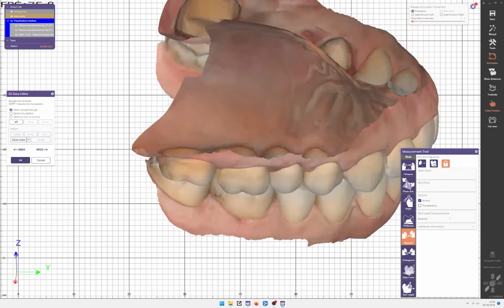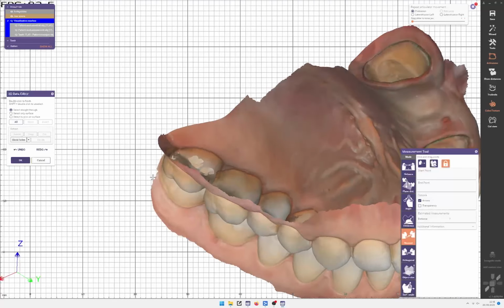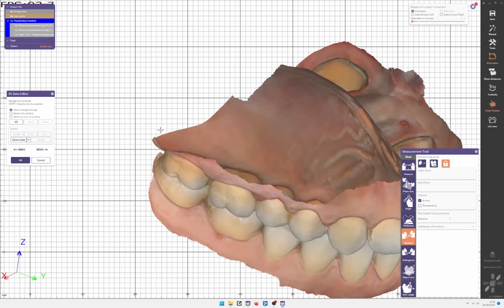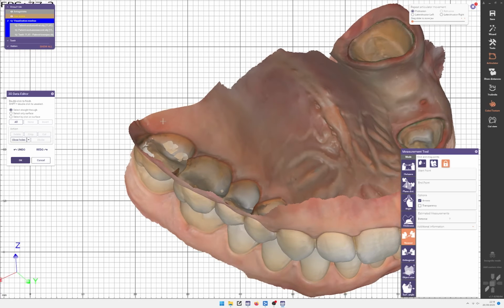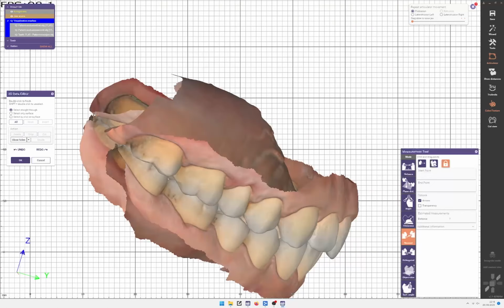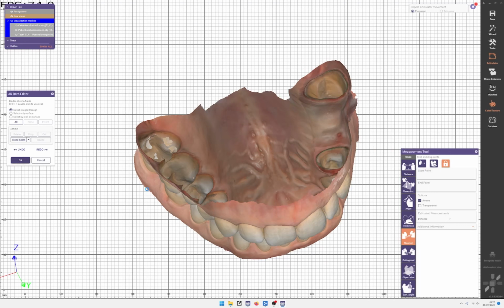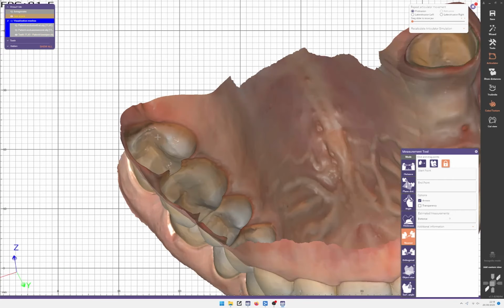And as I said, it can cause the algorithm not only to report the higher intersections, but usually it also fails. So that's a very common mistake, and a very common reason why the algorithm of automatically removing the intersecting meshes fails. If it fails, even though you don't have the gum parts intersecting, sometimes, I have no idea why, sometimes it also fails because of weird anomalies in the mesh. But if it fails due to this, I go to freeform scan data.